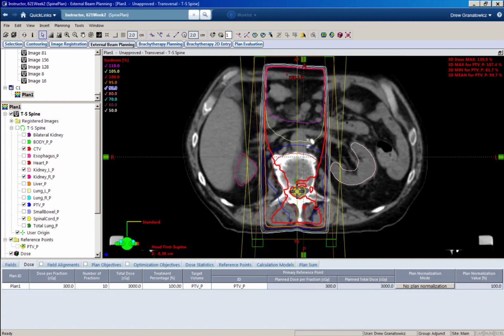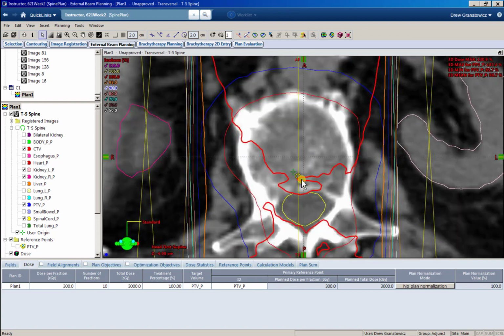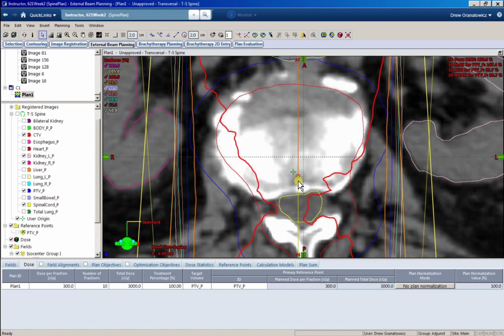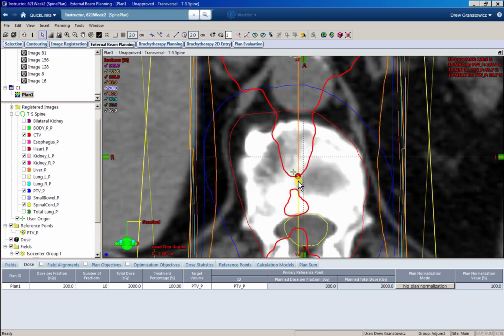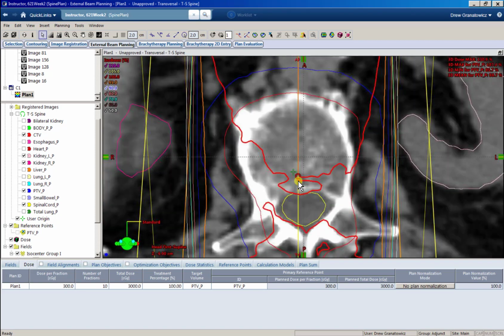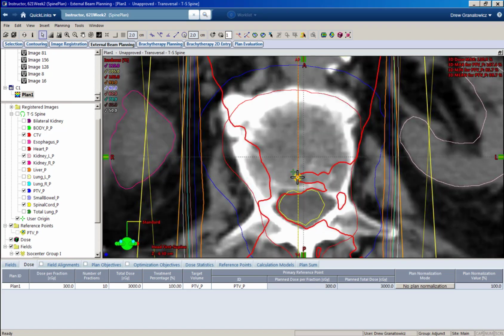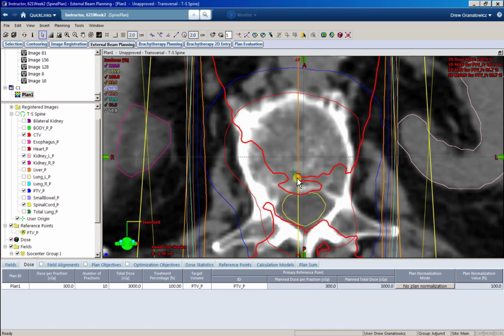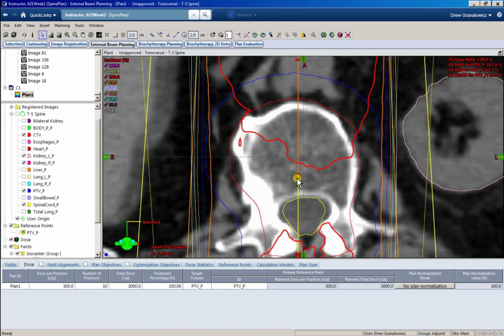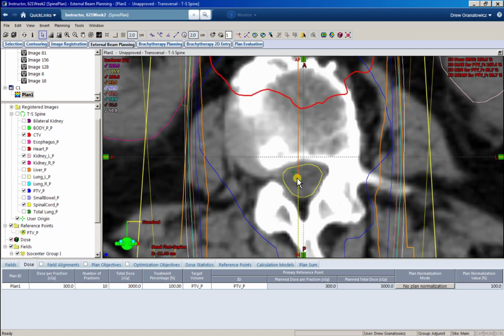So your Isocenter is this red dot, but just to clarify, you see how you can still see that even if you scroll up and down? Don't let that confuse you. You can see it changes from orange to a more solid red. So right where it changes to solid red is where your Isocenter's at, okay? And then it'll stay solid red superior to your Isocenter, and it'll stay orange inferior to your Isocenter, okay?